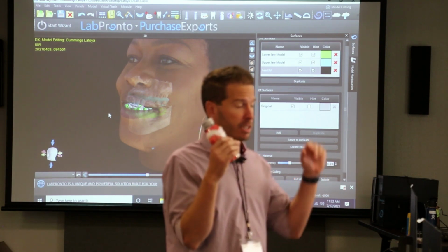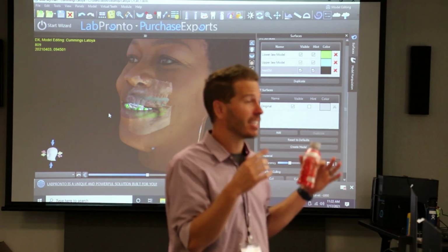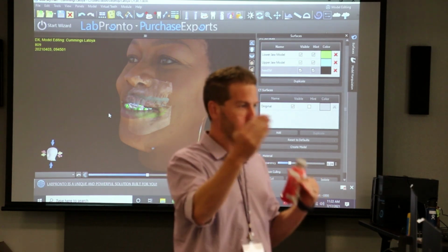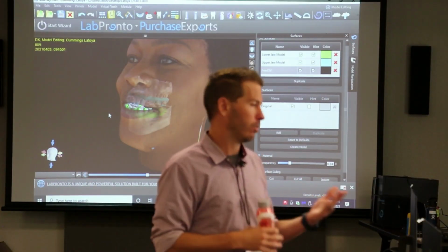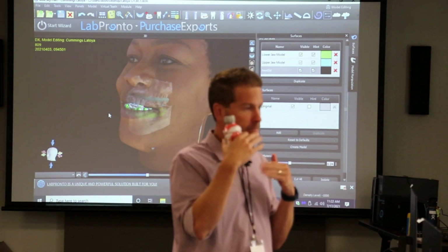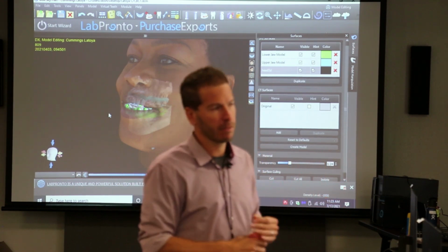Yeah, so you'd have a couple surfaces put on. You'd have a surface that was like the original STL, and then a surface of their wax up. So you have their 3D face, and they're smiling, and then you can turn on the visibility of both those models and say before and after. So when I'm done with you, you're here. Before you're here, and vice versa. You can't change the vertical of the face scan, but assuming you scanned the face kind of the same, where you want them to be.